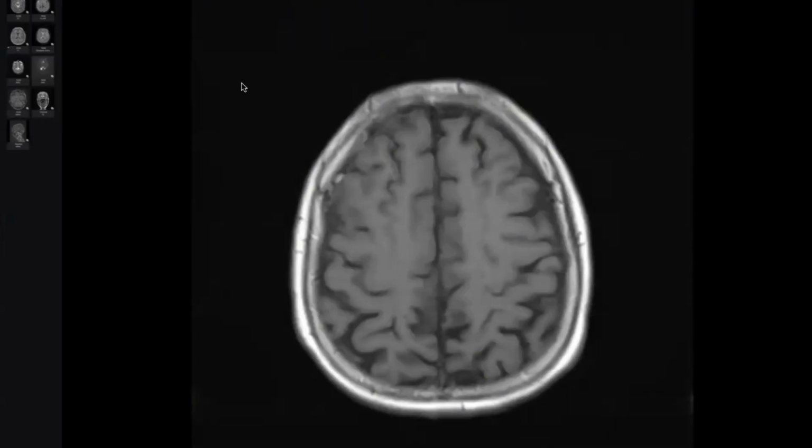In recent bleeding or subacute bleeding, T1 will help you more than SWI. SWI has the upper hand when it is a chronic bleeding. But both of them will show the bleeding.